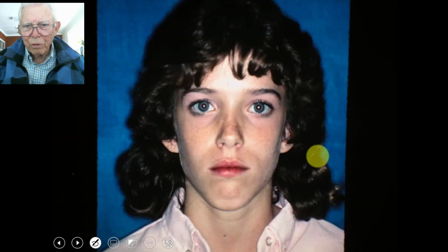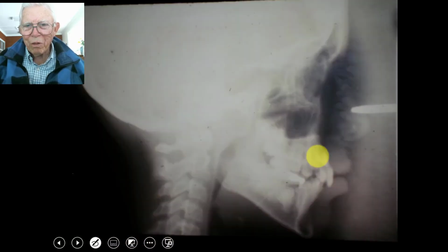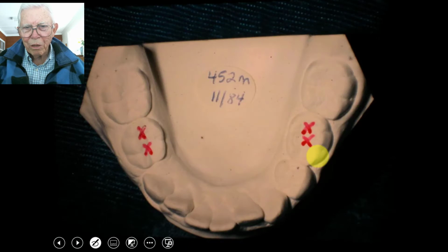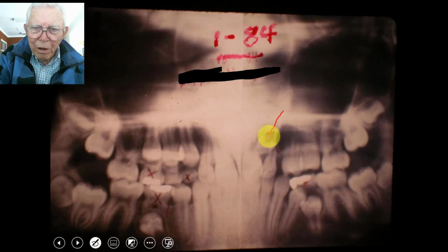We're going here. Now just remember how this face looks. I didn't get to change it there. And you can see the cephalometric of it. There it is again. There it is, indicated. All right. Here the cuspid is coming down, and you see the lateral root going.